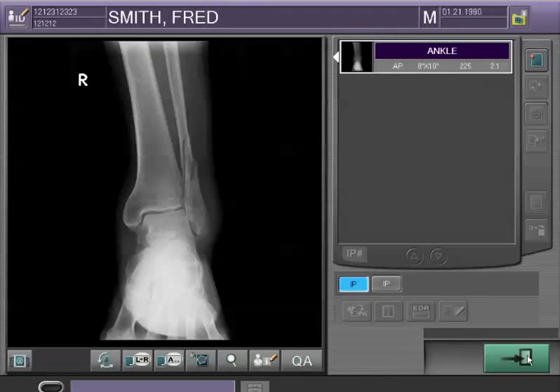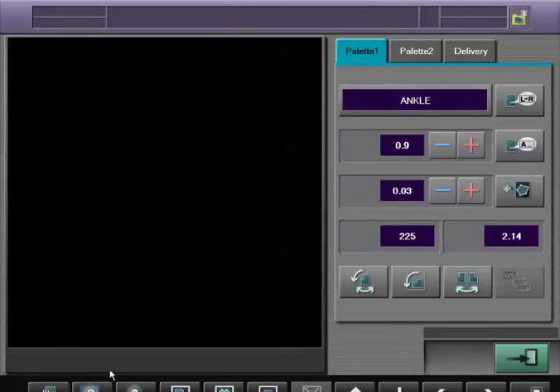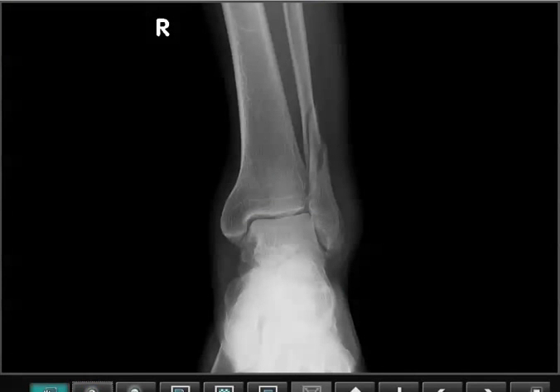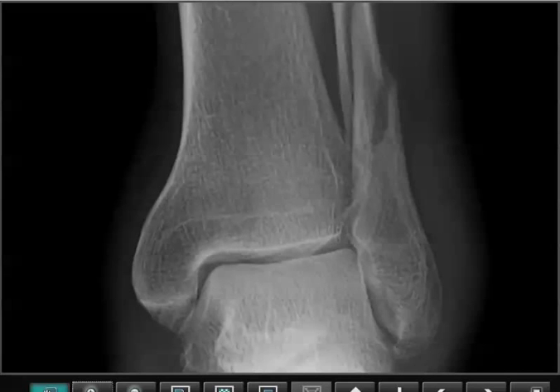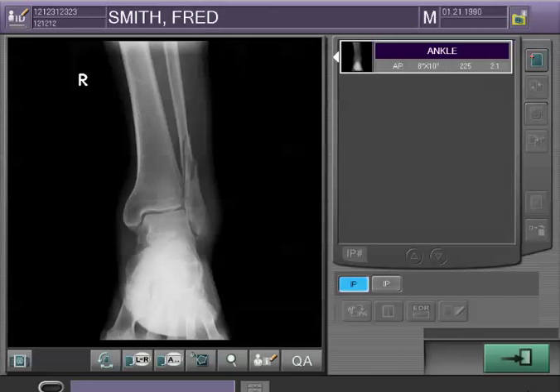The fifth shortcut icon on the toolbar is Magnify. If we select the magnifying glass, select Magnify, our entire image will fill the screen. If we select the Zoom In button, click on it, we can magnify the image and see additional information. The Magnify screen is often very useful to see motion or noise in an image. When we're complete looking at the images, we'll simply go to the right-hand side and select the Close the Door icon and return to the shortcut page.